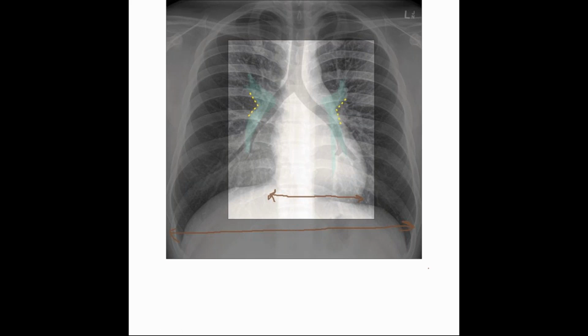Okay. And one more thing, what are the three constituents of hilum? One is the main bronchus. The second part is pulmonary artery. What is the third aspect? Lymph nodes is okay, fine. One more vascular structure, which I'll say. Yeah, pulmonary vein. Yes. So pulmonary vein and bronchial vessels are not that prominent in the hilum itself. They are found more in the periphery. Which hilum is higher?